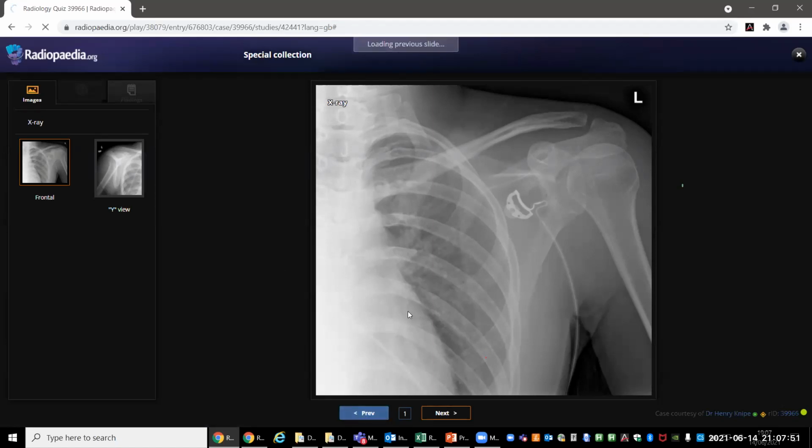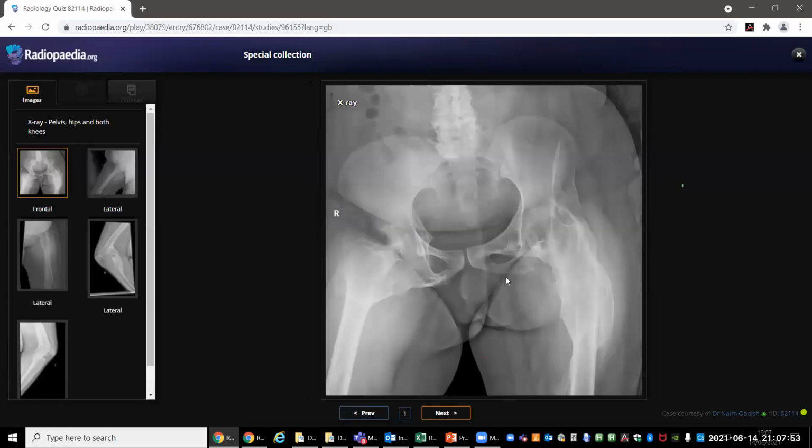Thank you. So for this one, you gave good differentials, possible history of trauma. In case of trauma, you're thinking of myositis ossificans. This is actually a case of myositis ossificans progressiva, and that's why it looks a bit aggressive, involving so many parts of the body. It's basically heterotopic ossification, and minor trauma could result in this kind of excessive callus formation, resulting in deformity. Okay, thank you.